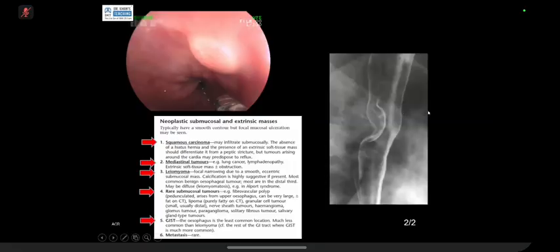On a CT scan, we can give you more. Here, submucosal, it can be cancers, but when there is cancer, usually you will find the mucosa is also gone. But these ones are interesting: leiomyoma and benign tumors like nerve sheath tumor, hemangioma, lipoma, etc. And I've seen lipomas, and interestingly, on a CT scan we can diagnose them, because we can diagnose low density. This is a lipoma, end of story. No need to do anything. So I just wanted to show you this. Okay, exam favorite.